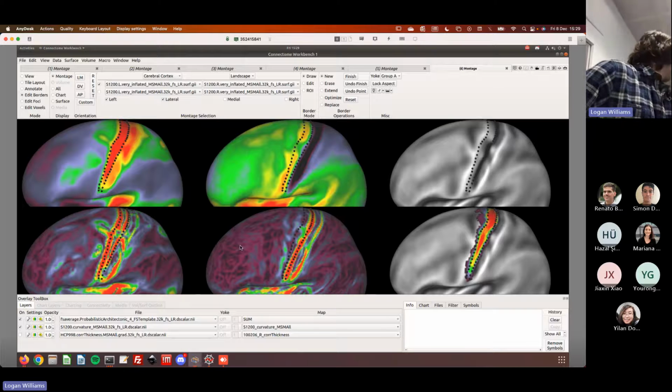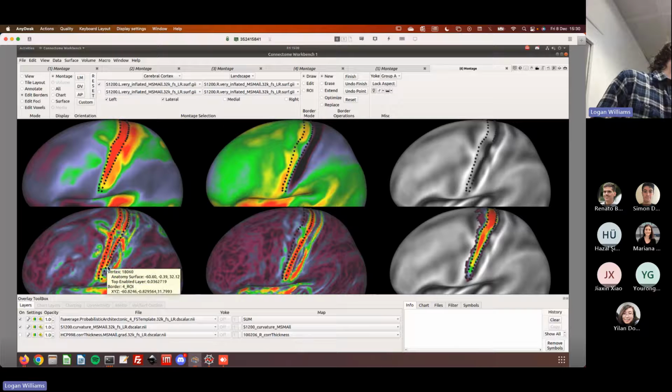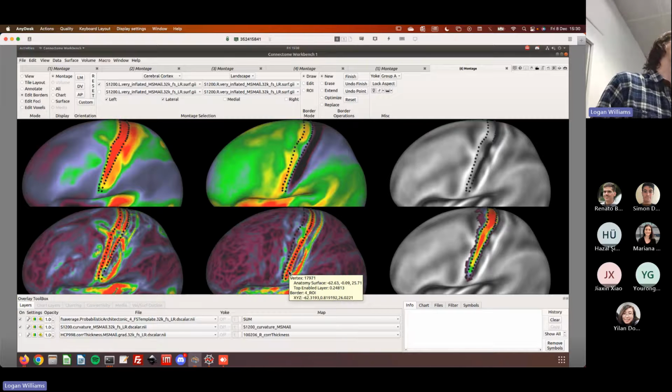And you're going for the middle. How did you define it on that one? So you try and use both of them. At the posterior border, they both line up. If I put the dot here, it's on a red line, which indicates that the gradient is high at this point, so myelin is changing quickly. That same dot also happens to be on the line where cortical thickness is changing the fastest. And so these boundaries agree with one another. So this is a multimodal posterior boundary for the primary motor cortex.